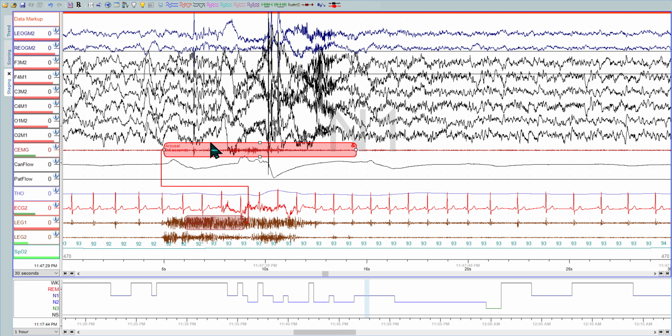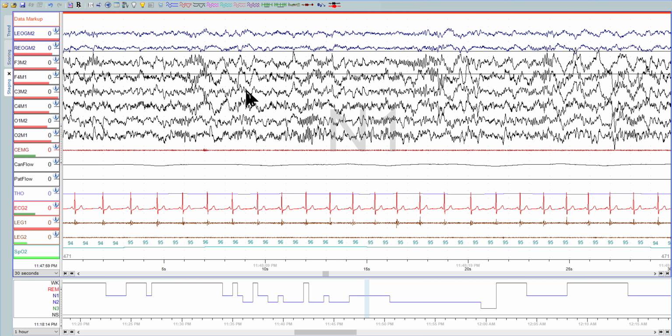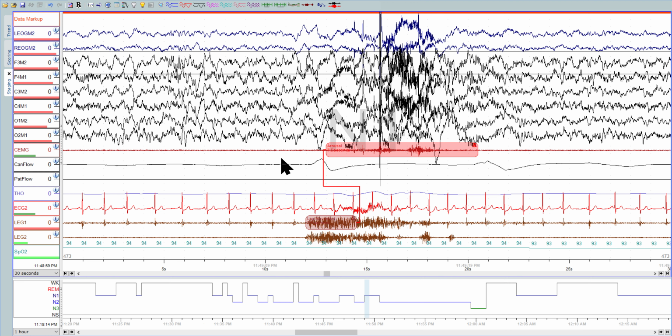Just extend that arousal a little bit. I think this is spindle here. 2. Change that line. 2. And then we keep this into a majority of the arousals in this side. So you've got 9, 10 seconds of stage 1 and 13 seconds of stage 2.